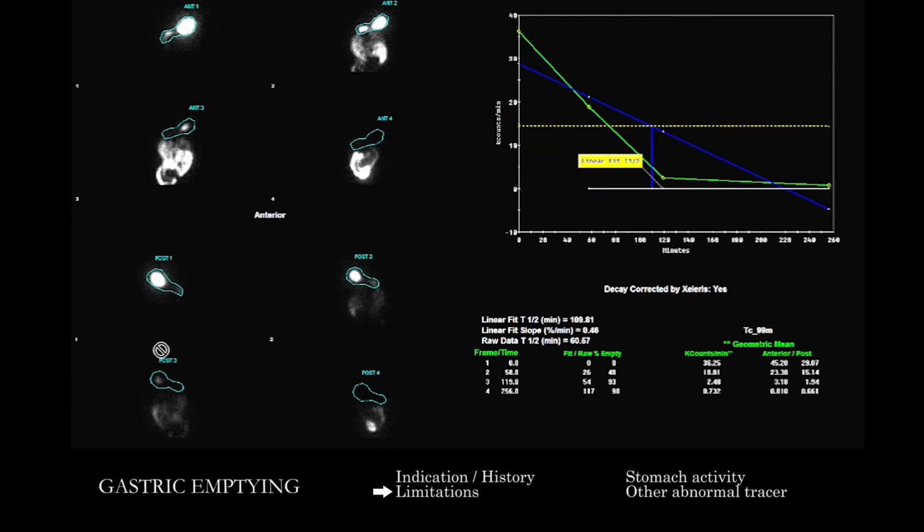And so once you've made sure that you have that context and the ROI is placed appropriately, you can track that, see if the patient has moved, see if the ROI is appropriately configured with any motion. You're going to be provided counts at different time points.